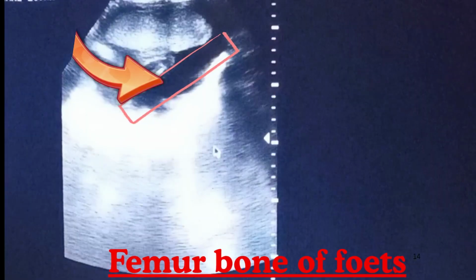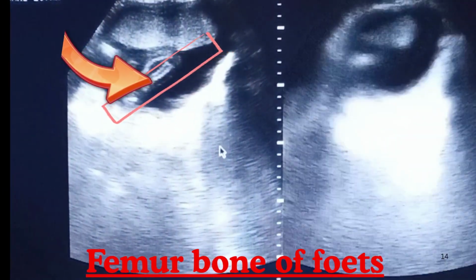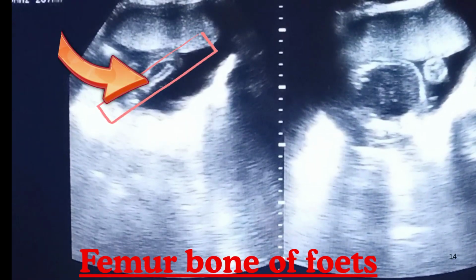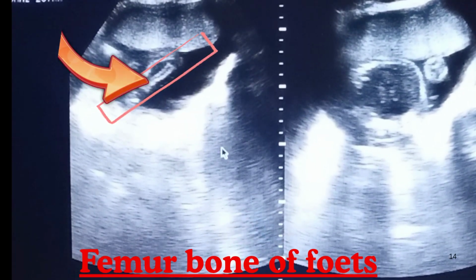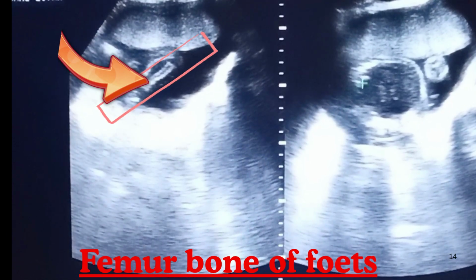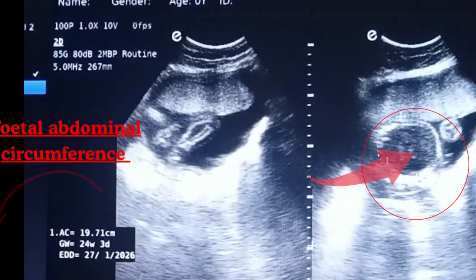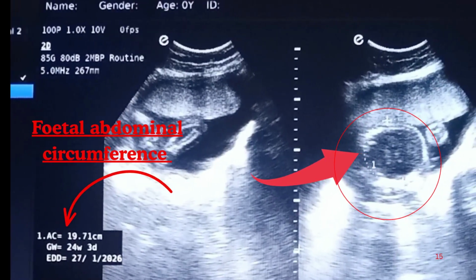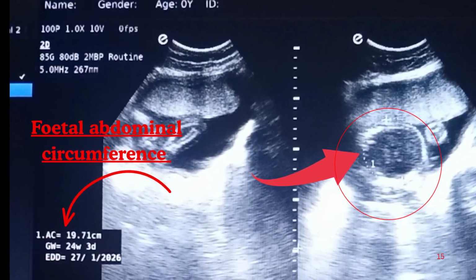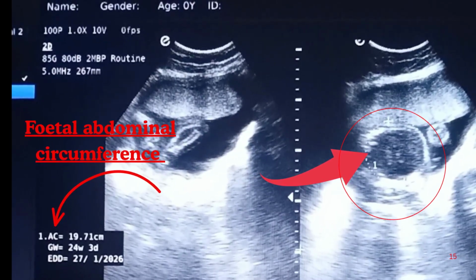Inside the circle, the abdominal circumference of the fetus can be seen. Here, the arrow is pointing to the fetal femur, which is highlighted within the rectangular outline. On ultrasound, the femur appears as a bright, linear echogenic structure representing the ossified shaft of the thigh bone. It is usually seen as a long, straight, and well-defined echogenic line, often measured from one end of the ossified diaphysis to the other to assess femur length, FL, an important parameter for estimating gestational age and fetal growth.